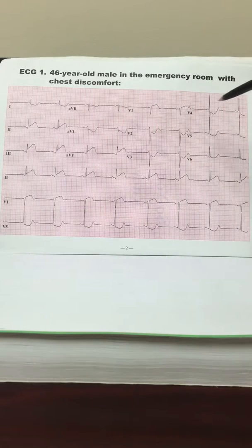If you did have wide QRS waves, that would be a sign of possible left or right bundle branch block, which we will talk about in another video. Once we've done that, we can look more in depth at the QRS complexes for what we call Q waves.